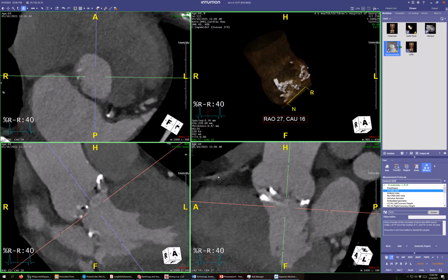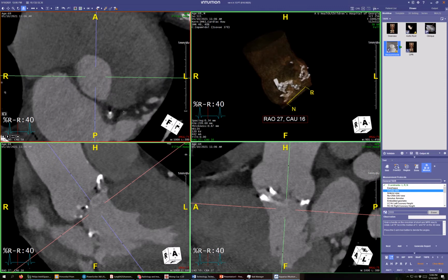So, one of the issues here is it turns the orientation of everything else. Did that affect? Yeah, we're not quite in plane anymore. But that's the gist of it. Let's take that picture. Right?